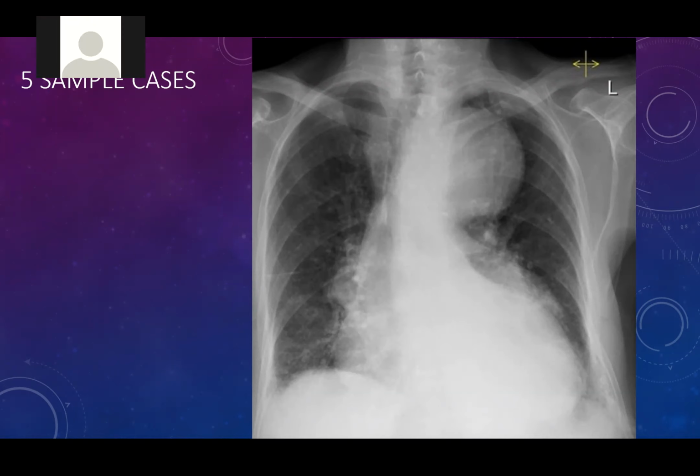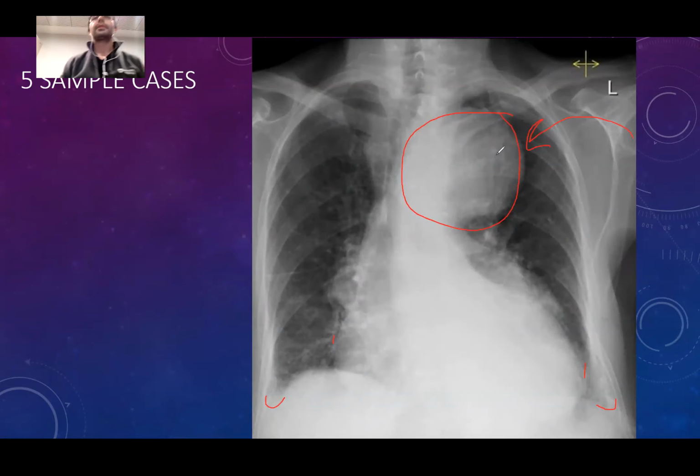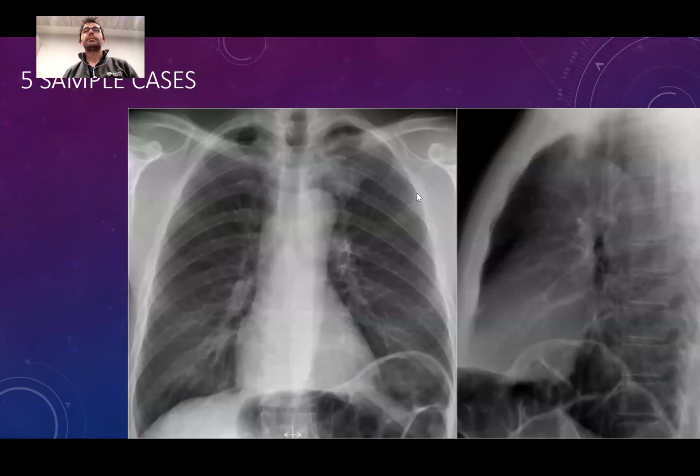Cardiomegaly is seen. Yeah, it's true. Costophrenic angles are barely seen. Barely, yeah. Also, is there a lesion in the left lung? This one, right? Yes. Can anybody name it? This is an aneurysm, right? It's an aneurysm on the aortic arch. It's a huge one, a very dangerous aneurysm. Thank you, doctor.